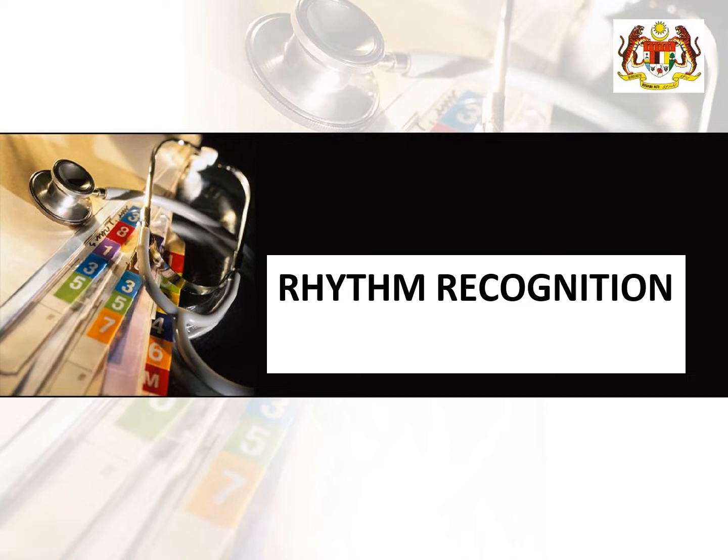In this lecture, we will show you the common rhythms you need to know, and the characteristics and signs of each rhythm based on the ECG. We will not discuss the treatment, because treatment depends on the patient's condition, whether the patient is stable or unstable.